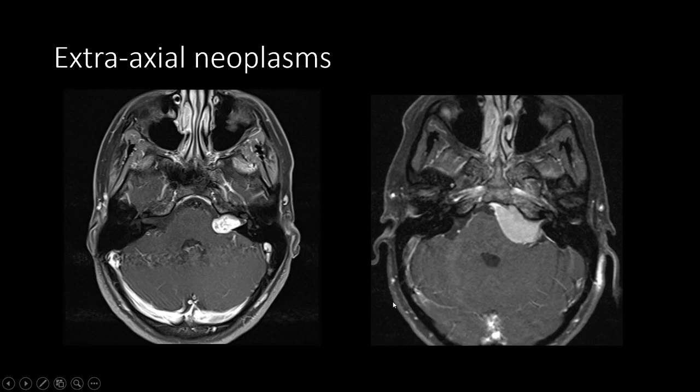So when it comes to cerebellopontine angle masses, the extraaxial CP angle masses, a common differential diagnosis is vestibular schwannoma versus meningioma. And there are several clues that can help differentiate these diagnostic possibilities. Vestibular schwannomas should be centered on the axis of the internal auditory canal. It should, when it can, expand the opening of the internal auditory canal, like in this case.